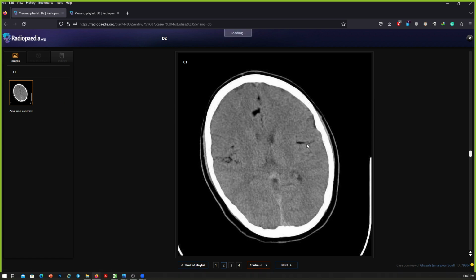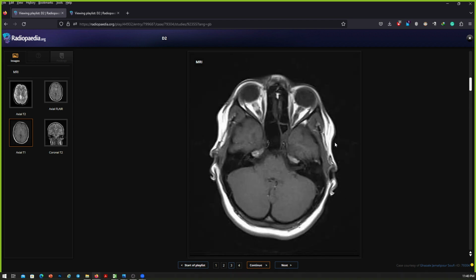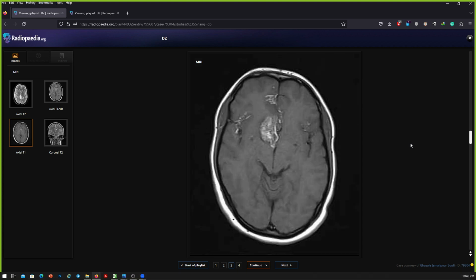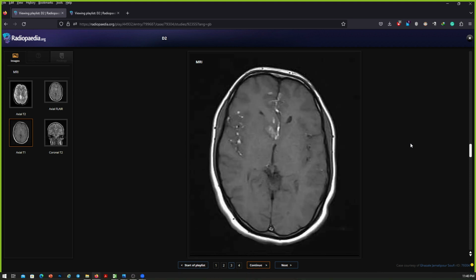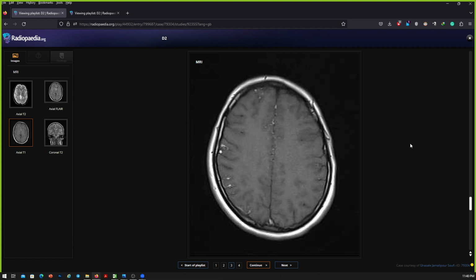I'll just show you the MRI for this case. Just describe the findings on this axial T1 sequence and then we'll wrap up this case quickly. Okay. So here again, seen high intensity of the mass on T1. So this supports that it's a fat intensity. It's seen at the right, I think. I'm not sure of the exact location actually, but also multiple hyperintense foci seen within the subarachnoid cisterns and along the falx. So it's a ruptured dermoid cyst.